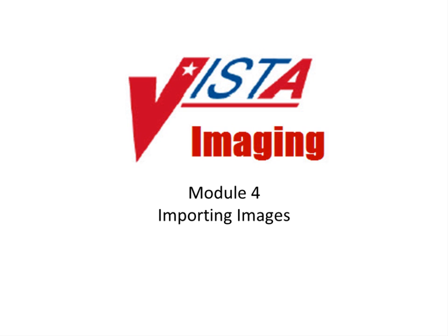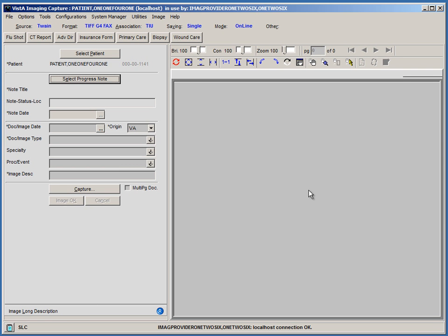Importing is used to capture images such as digital photographs, images from endoscopy studies, and documents in electronic format such as PDFs. Images can be imported from a local workstation, a network folder, a digital camera, CD, or DVD. To demonstrate the image importing processes, I have already logged in to Vista Imaging Capture and selected a patient.